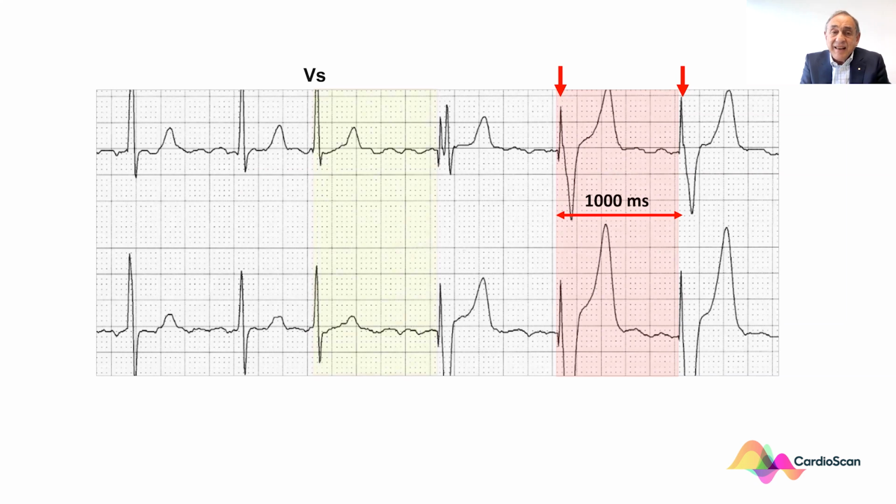One can see then that we have a ventricular sensed beat, another 1,000 milliseconds, and then the next beat that occurs is again a fusion beat, because we have a ventricular stimulus artifact followed by a QRS and T wave, but virtually all of it is due to the sinus mechanism. But again, look at the T waves, and you can see the contribution of each.